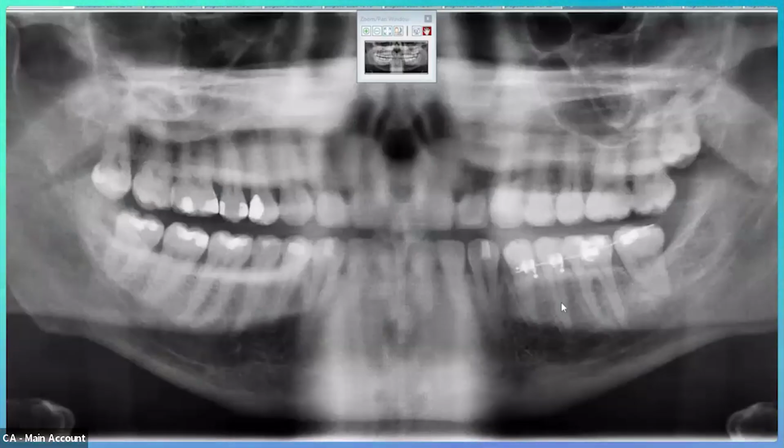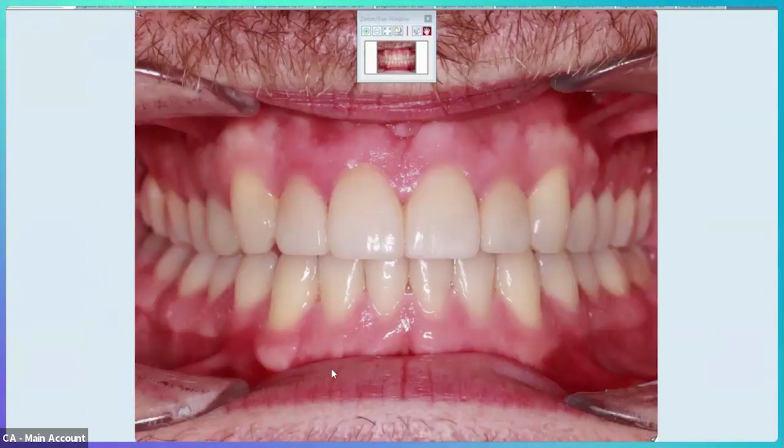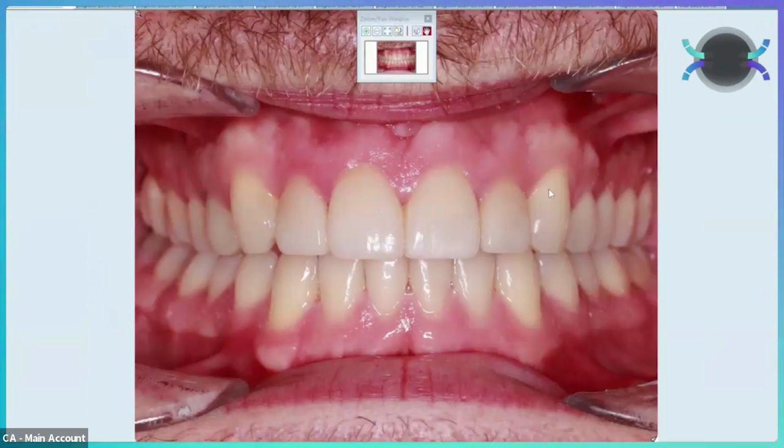And then here's his pan once we have uprighted that root. Now, I'll be honest with you guys, this is not the most efficient plan in the world. There were a number of things I would do completely differently now in terms of how I would deal with that terminal tooth, because we realized that we were trying to move the root too fast. We could have done this with aligners. We could have been successful, but we had a fatal flaw.